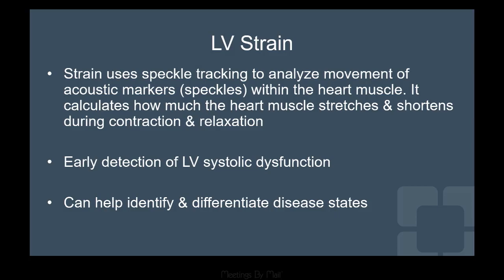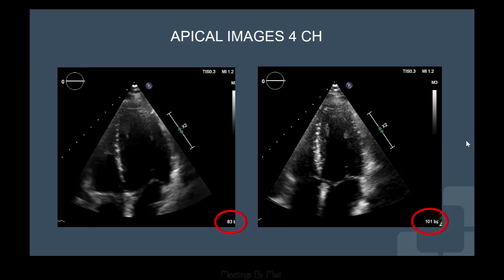But keep in mind what strain is doing for you. It's to help detect early LV dysfunction. So as long as your pattern is tracking well and you've made all the adjustments and your technical parameters have been met, if it's tracking abnormal or giving you an abnormal value, it's supposed to detect underlying dysfunction. So EF and strain aren't always going to match. So that's a very confusing thing for junior sonographers. And also there's been identifiable strain patterns that we've studied and been able to help differentiate HOCM, apical HOCM, our cherry on top, amyloid kind of cases. So there have been identifiable cases as well.